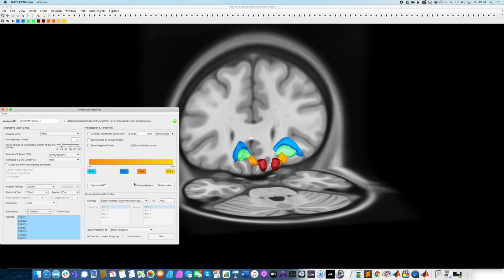So this is a crucial steering thing for all of the three tools. It works the same way in all of them, and maybe in the beginning it makes sense to deselect that one. What it does is that as soon as I change something, it will automatically refresh the view. But maybe in the beginning we don't want that. We want to have control, and we want to be able to click the refresh view button.